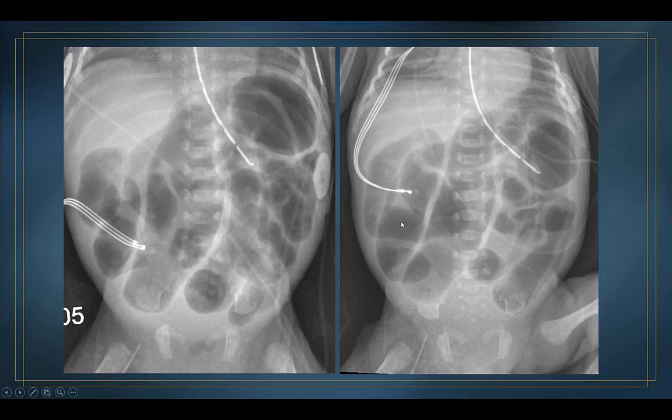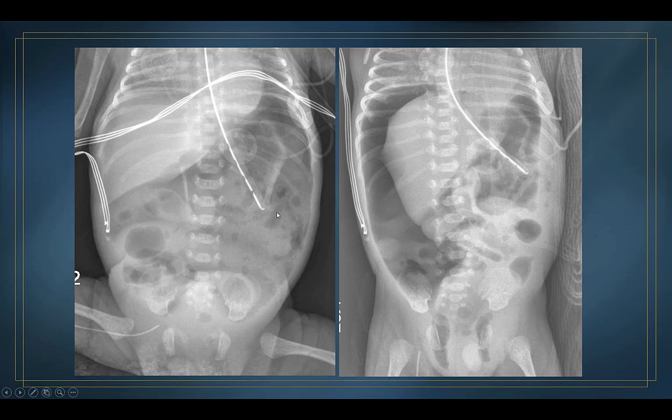It looks very similar. And then the day after that last film was done, this was his radiograph, which again shows the entire liver is way too lucent. And by the way, something else you can compare the lucency of the liver to, if you have a normally aerated left lower lobe, is that the liver should also be denser than the heart. Because a heart with a normal left lower lobe, because of the air behind it, should be more lucent than the liver. But the abdominal wall musculature is the best thing to compare it to. And by the way, in this patient, there's air from the pneumoperitoneum extending into the right and left scrotum.